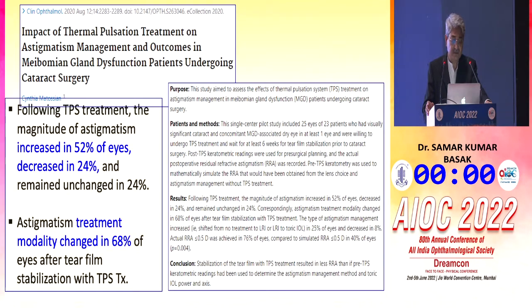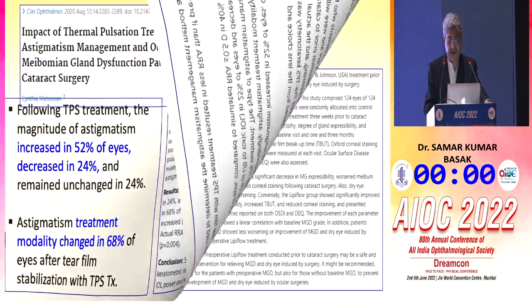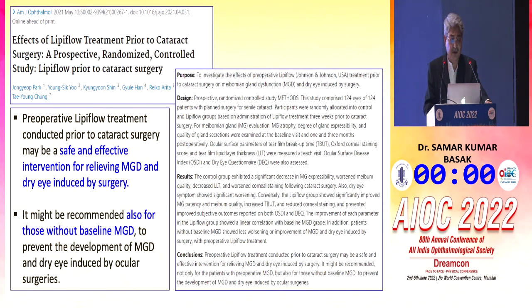Actually, the algorithm has been changed. Astigmatism treatment, actually, if you do this treatment, your tear film stability and your final power calculation for multifocal toric may be a little different. So you must follow it.